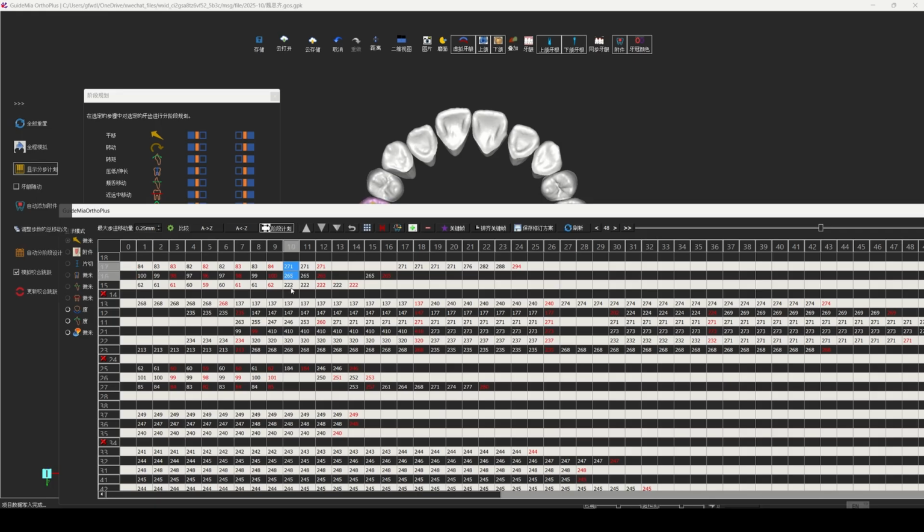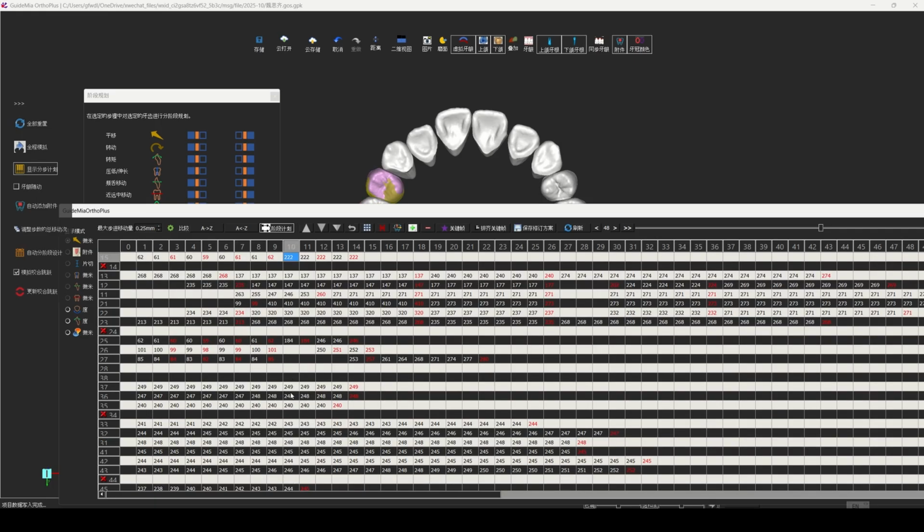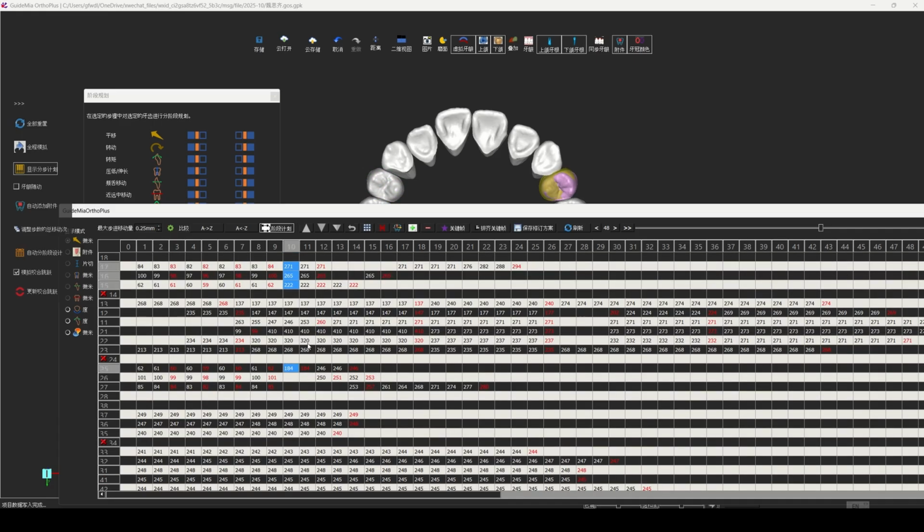What you notice here is that when we drag and drop, it's a very conceptual approach. We don't have to worry about how accurate those alignments are and whether they are going to have collisions or gaps at this step. It's a very conceptual approach. We give rough orders and alignment. The system will take care of the refinement part later.